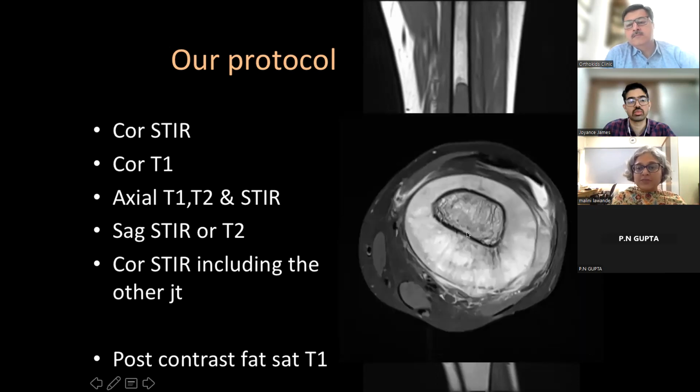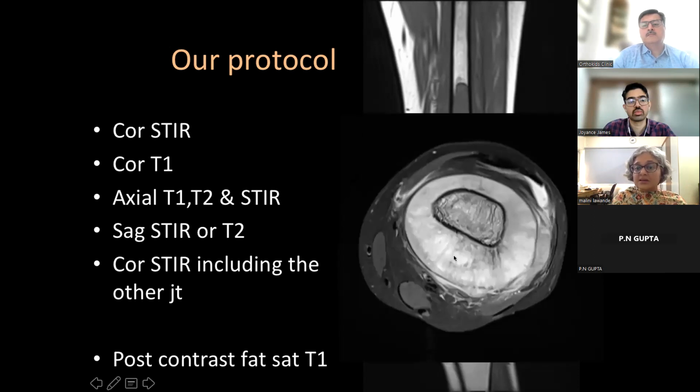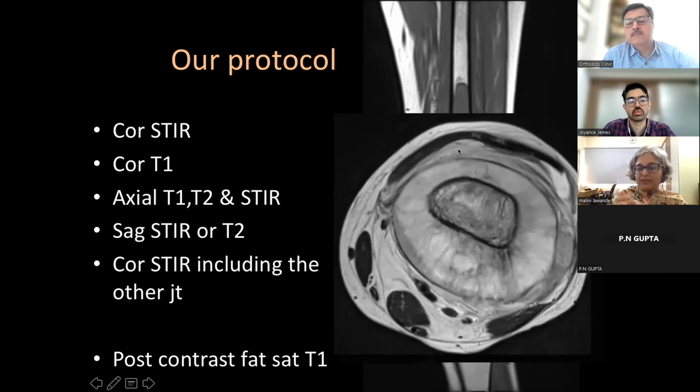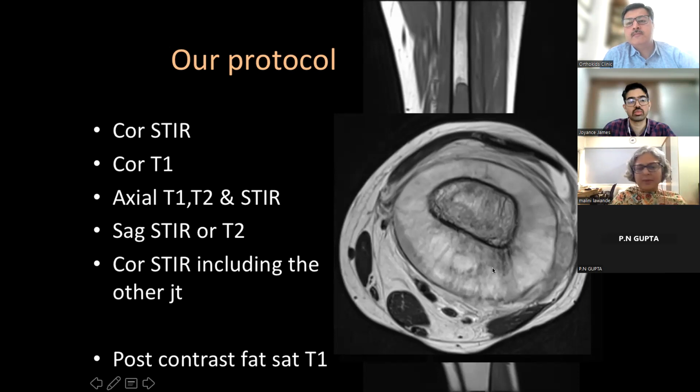Also, if you notice, fat gives a good outline. So you can see neurovascular structure involvement and intermuscular planes well on that. STIR shows you the pathology, but everything else looks dark. T2 is kind of in between these two. So you can see the neurovascular structure still well, and you can still see the bright tumor. So you need a combination of these. A sagittal plane, again depending on where the lesion is located, you may do as a STIR or T2.